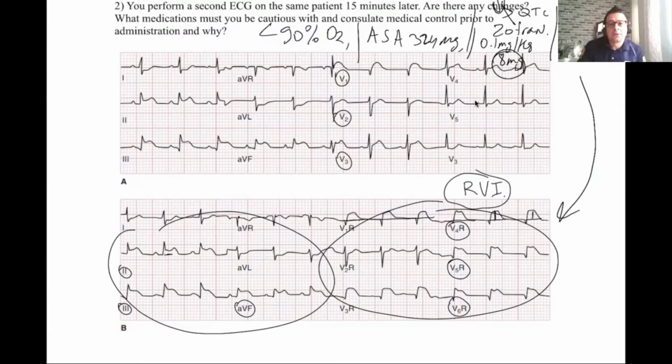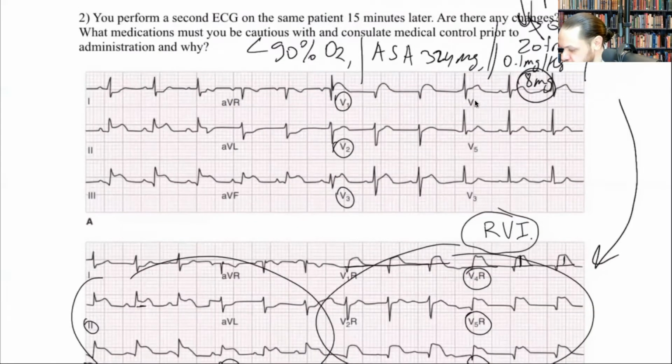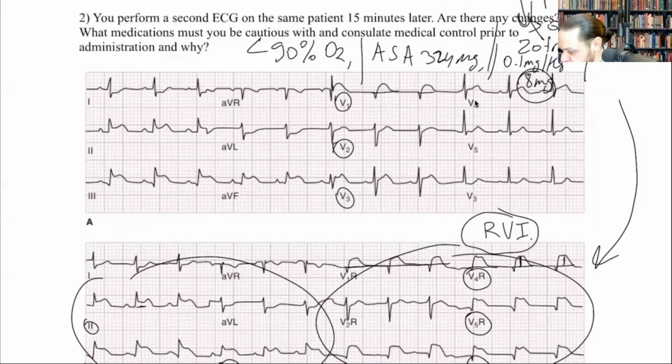Yes. So in the first strip here, V1, the T looks sinusoidal already, right? Is that just because it's elevated that way and it's kind of okay? It's not an electrolyte imbalance? No, or could it be? That's not electrolyte imbalance. It does look elevated to me here, right? And you may have elevations in V1. This is also suggestive of RV infarction. So RV infarction can show you that. So this is elevation. This is not T-wave abnormality. This is actually ST segment elevation in V1.